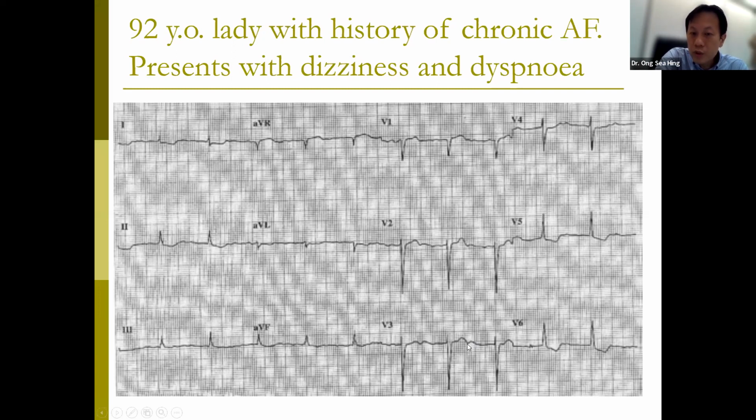Okay, so this could be a U wave, but overall there may or may not be convincing P waves. So this patient possibly is still in sinus rhythm with a very prolonged PR interval, and maybe in paroxysmal AF.